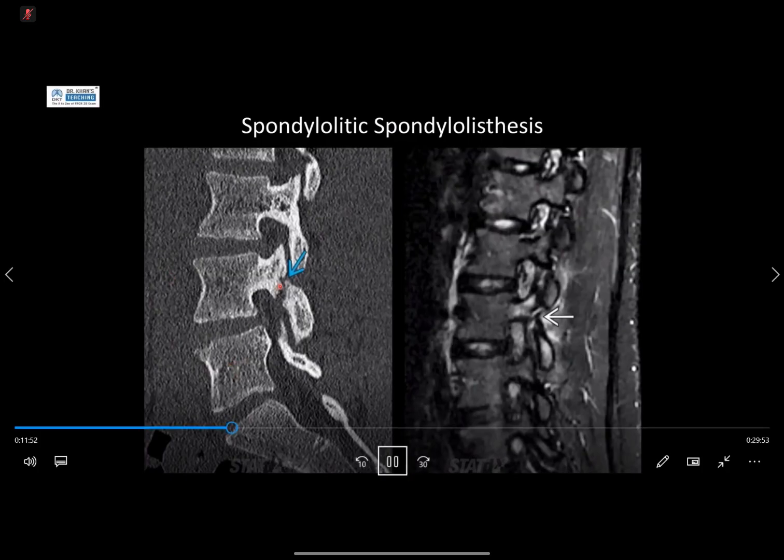It can be chronic, it can be acute on chronic. And then on your MRI, of course, if it's acute, you see more marrow edema and soft tissue changes. If it's more chronic, because something happened and then things have changed, then you see less of the soft tissue inflammation surrounding it. So often you see it in gymnasts or sports which need a lot of hyperextension, like baseball throwing. So a past event.